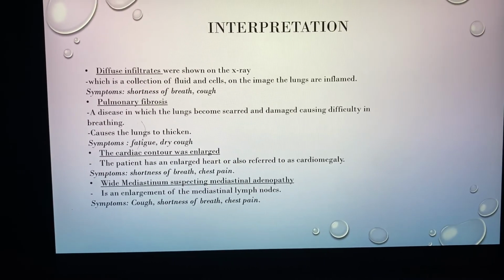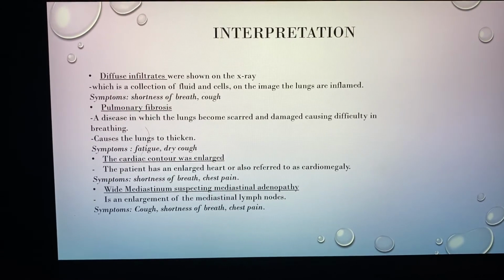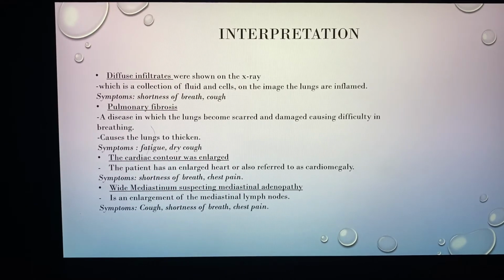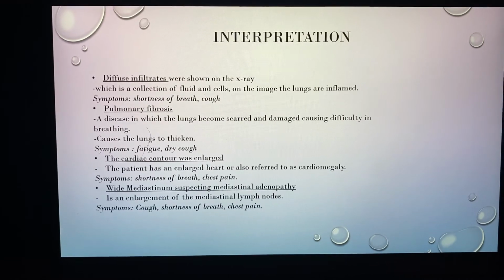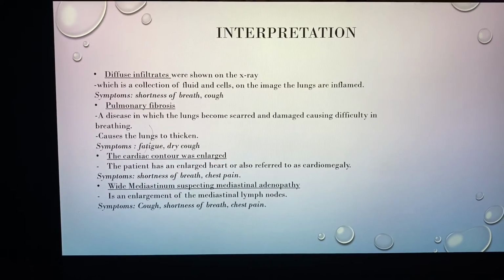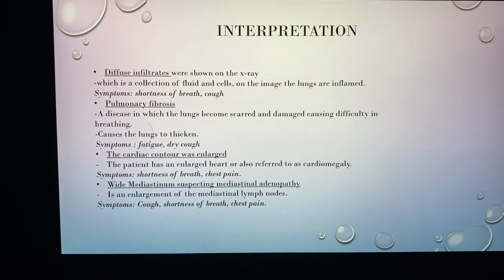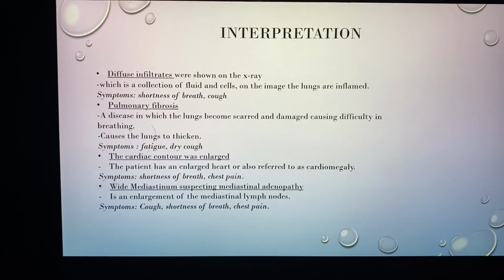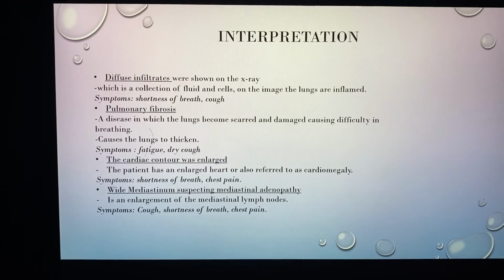Then the cardiac contour was enlarged. So I'll show you all that after. The patient has an enlarged heart, also referred to as cardiomegaly. Symptoms for someone who has this are shortness of breath and chest pain as well. Wide mediastinum, suspecting mediastinal adenopathy, is enlargement of the mediastinal lymph nodes, and the symptoms are the same: a cough and shortness of breath.